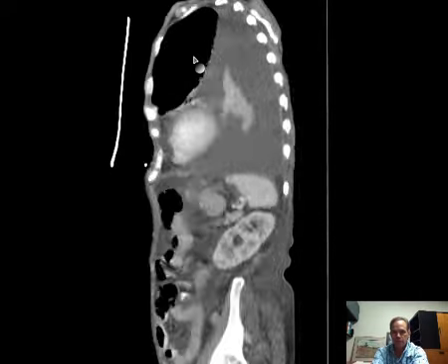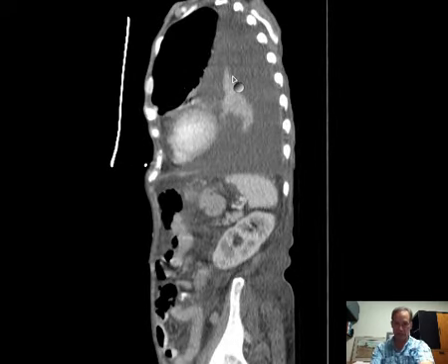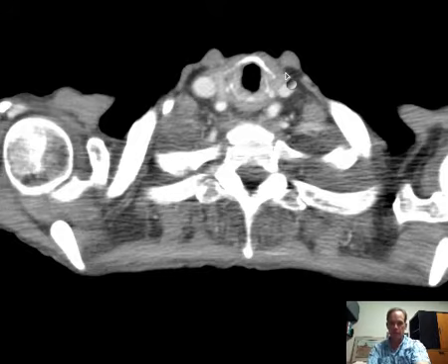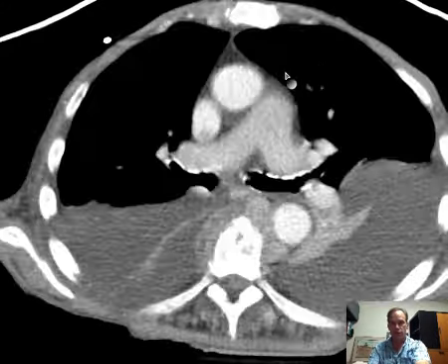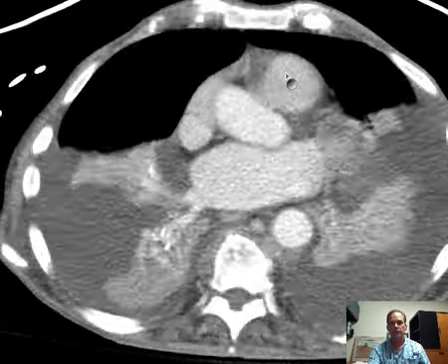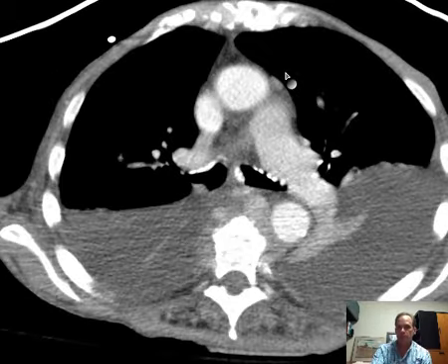So that is a summary of the anatomy of the lobes, and it's a depiction of the typical appearances of atelectasis of the lobes of the lung. Now let's switch gears to the vessels, and we'll look at the vessels of the mediastinum, of which there are two most important arterial vessels, and they are the aorta and the pulmonary artery.